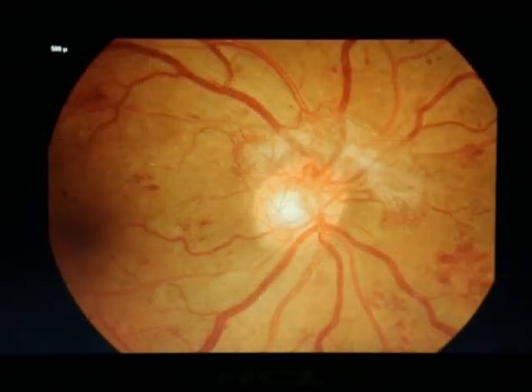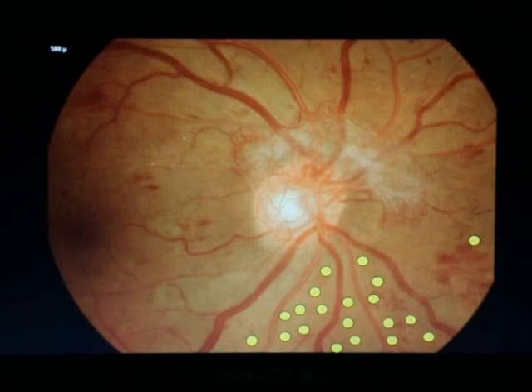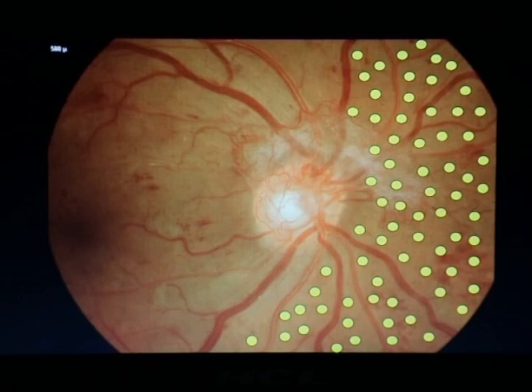To the best of our knowledge, our animation technique is the first of its kind that elegantly demonstrates laser techniques and allows the greenhorn a simulated hands-on experience on the computer, wherein successive laser spots can be delivered by the click of a mouse or by pressing the advance button on the keyboard. It can also be used effectively for patient education.